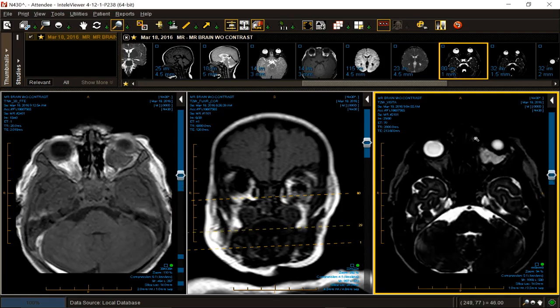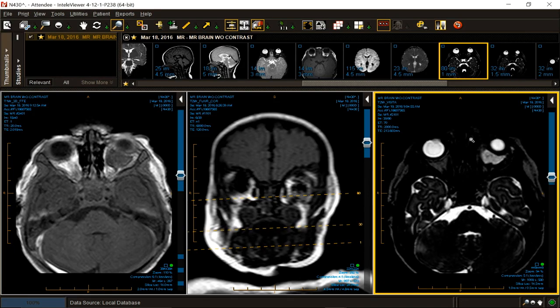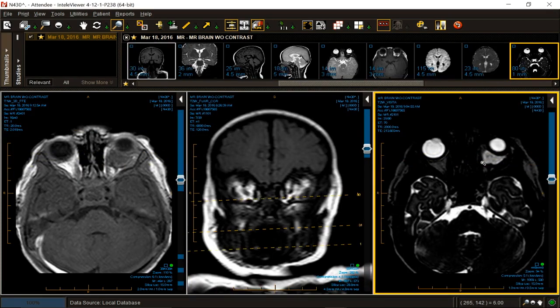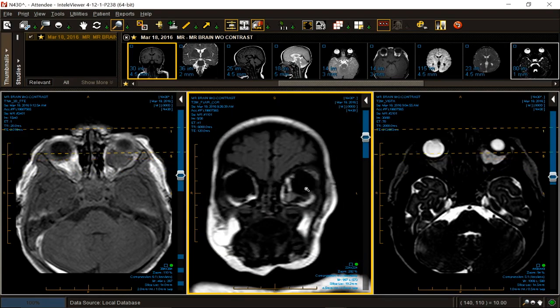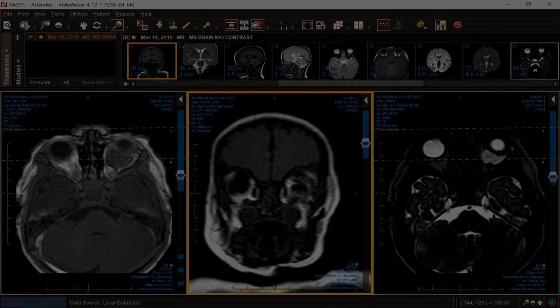Now, the most common intraconal mass in the setting of a younger individual with or without proptosis is a hemangioma, cavernous hemangioma. What is the other differential diagnostic consideration for cavernous hemangioma, which, by the way, respects the cone? The one that is less likely to respect the cone and dissect out of the cone, lymphangioma. Lymphangiomas are more likely to have higher signal on T1. Lymphangiomas are more likely to have fluid levels. Lymphangiomas are much more likely to bleed.